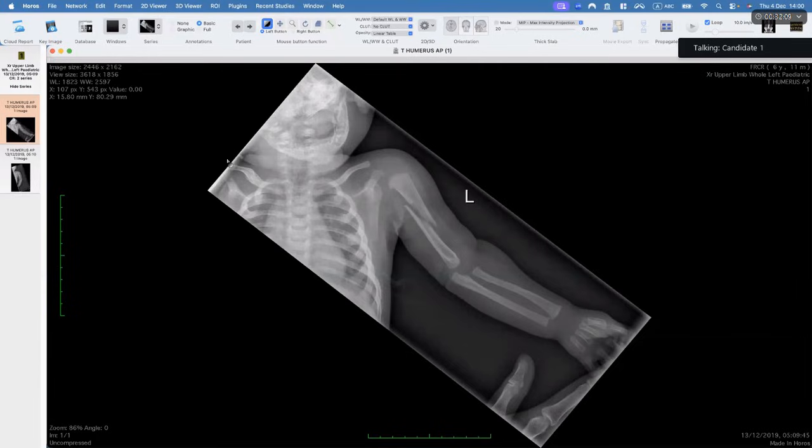So now I'm also looking at the ribs for the presence of any fracture. The mother is adamant that she would never hurt her child. And she's saying, nope, you're wrong. Is there anything else that suggests that this may be an NAI case? One of the ribs on the left side also appears expanded anteriorly. So I'm suspecting, and I need further X-rays to confirm these findings.